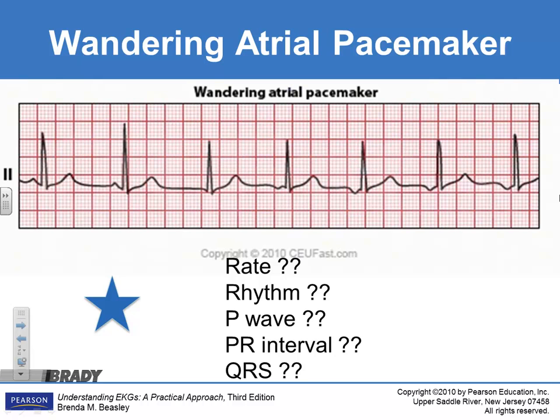Okay, look at this one. Is that the same one? No, it's a different one. Look at the P waves, look at the PR intervals. Is this regular, irregular? What's the rate? I think it's pretty regular. Maybe a slight irregularity on the second one to the third one. Maybe that's a little wide, but not enough to change it.